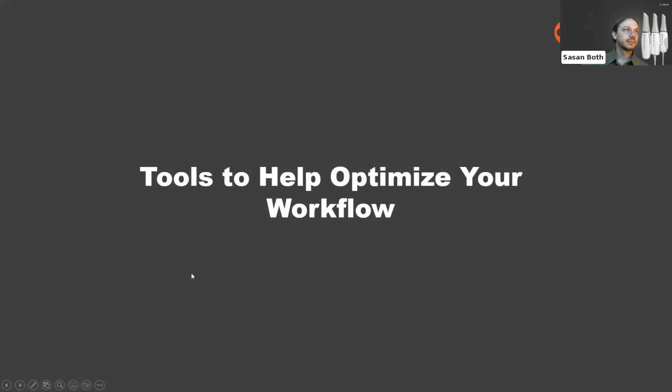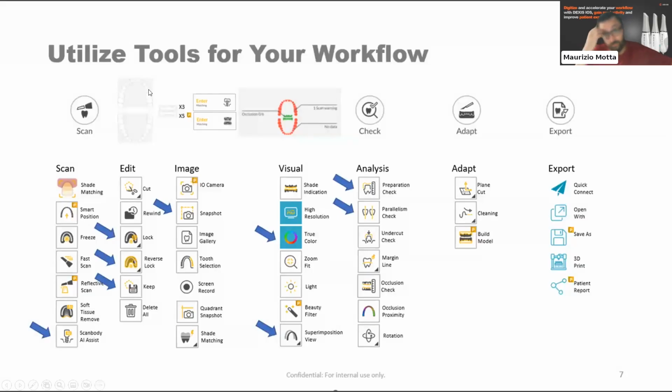So let's go now with the tool and the software. We will focus on the tool to optimize your workflow. Similar to the previous webinar, this is the list of the software that ScanFlow has. And today we will focus on some of the tools that are actually in common with the restoration workflow. What we will focus on more in depth today is the scan body AI assist, which I will explain how it works at the end of the webinar.